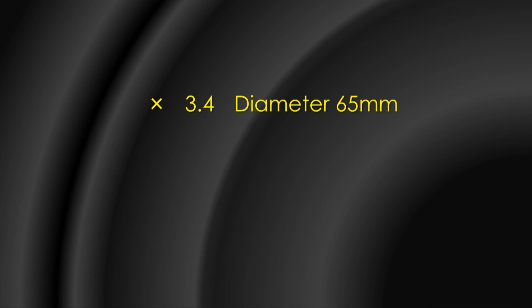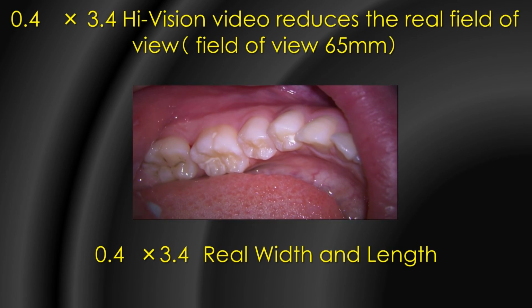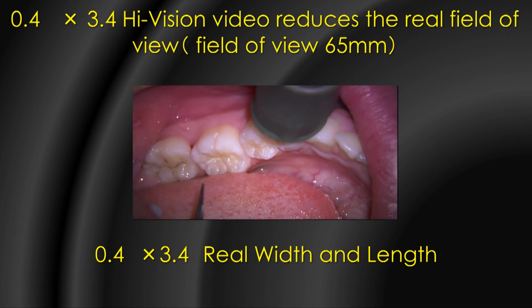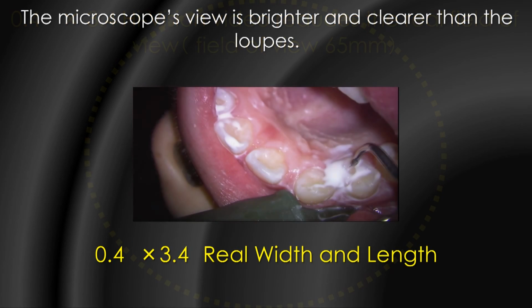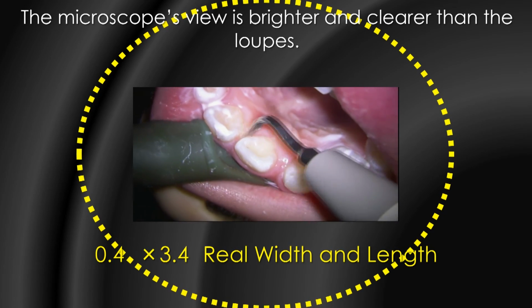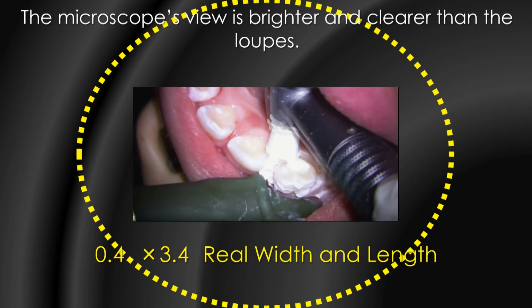So 3.4 diameters, 65 millimeters field of view. So this is the surgical microscope's field of view. The microscope's field of view is brighter and clearer than the loupes'.